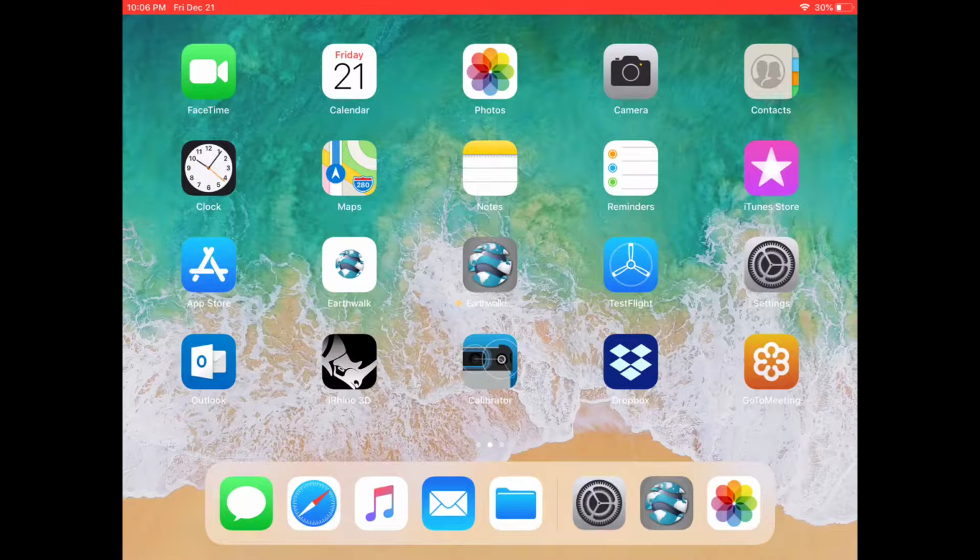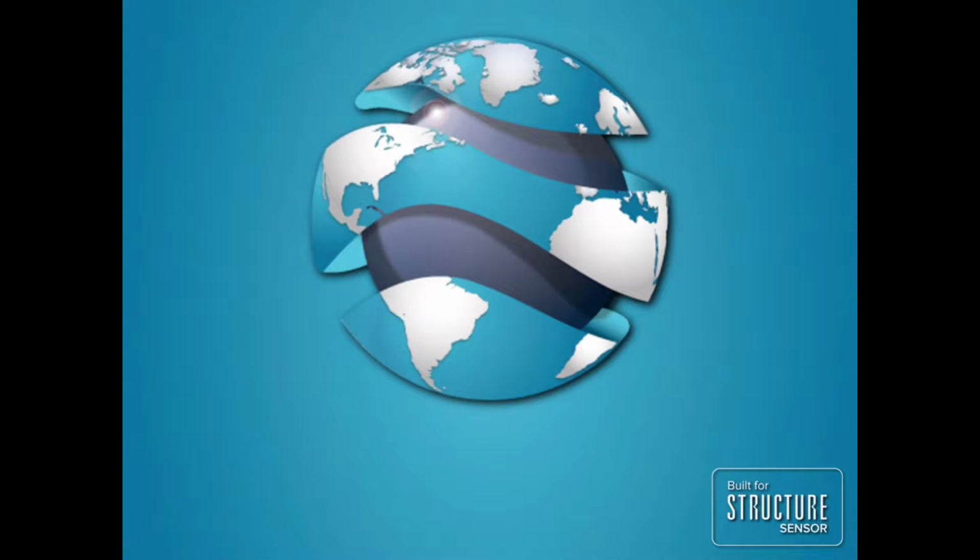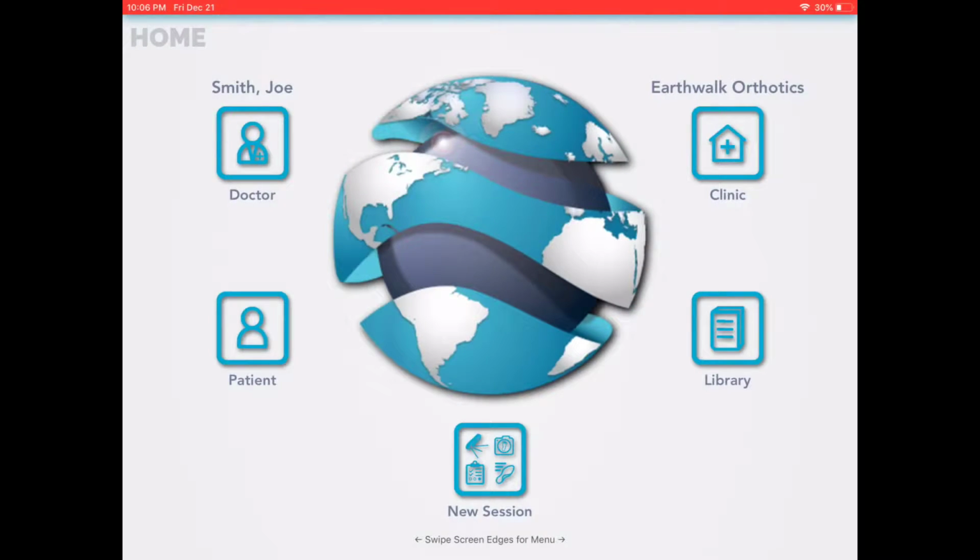In this brief video, we're going to talk a little bit more about navigation and the new session and library views in particular. So again, if you open up the Earthwalk iScan app, it's going to take you to our home screen, and we've talked about doctor, clinic, patient, and library in our previous videos. So now we're going to talk about new session and library in particular.